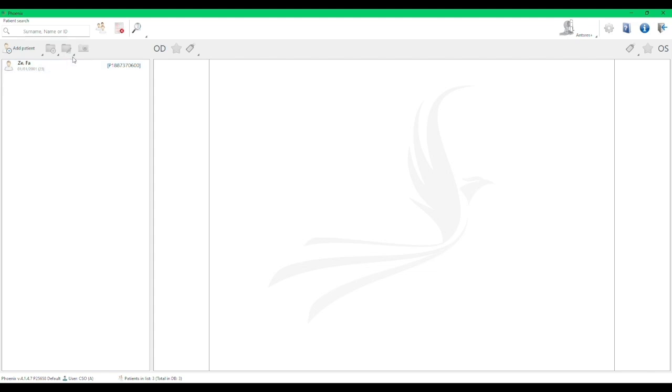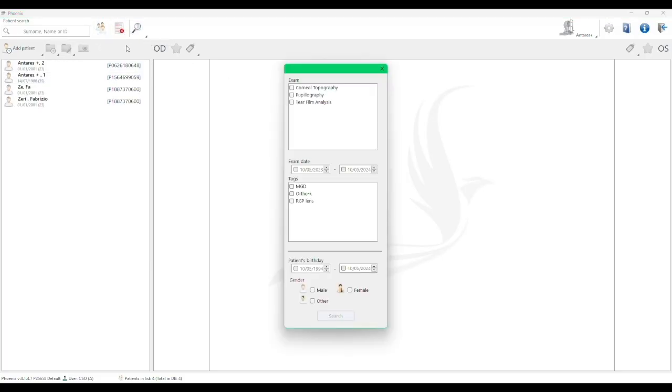So let's continue to show how it's possible to see all the list and search for a patient, in this direct way. Because you read the name of the patients or the person that you are looking for, or clearly this list can be hidden. And also I can look directly for a patient, trying to understand if there is, for example, a particular clinical condition, or if I saved a test or an assessment with a tag.